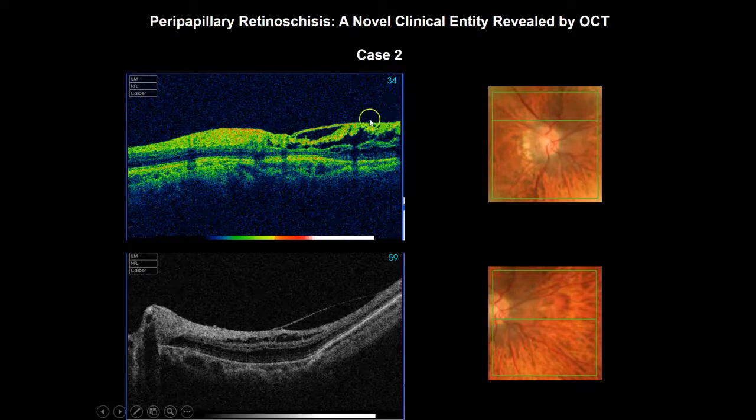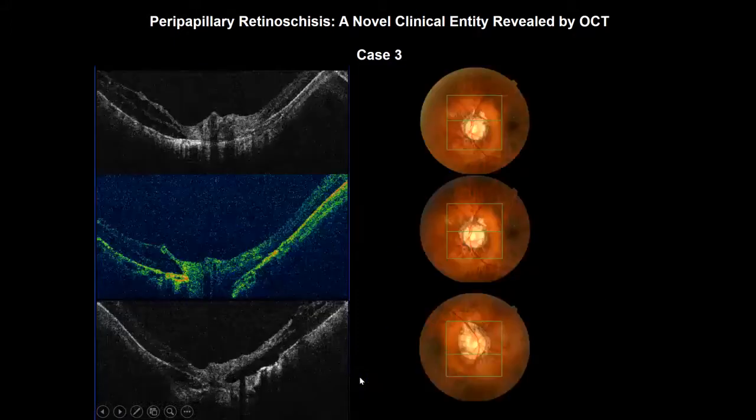Here we go, some tissue which looks like it might be on the surface of the retina. You might see this clinically. It may be very subtle to you. The OCT is going to be much more helpful to show you that there's extra tissue. This could be inflammatory. It could be just traction of the vitreous onto the retina. Those are all certainly possibilities. And over here is another group of patients.